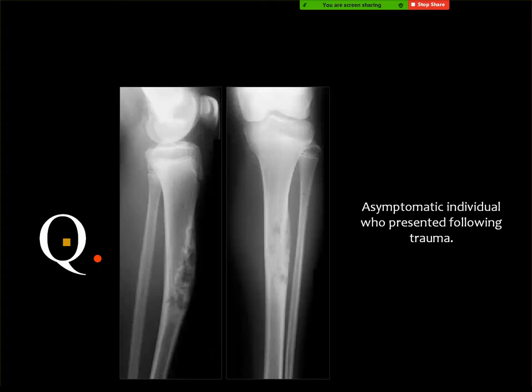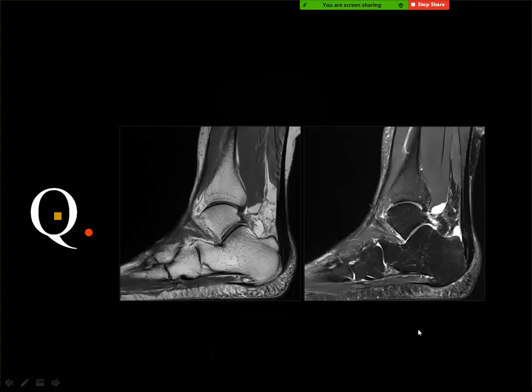Adamantinoma, this is of tibia. Yes, and this is a spot diagnosis lesion which is located in the anterior part of the tibia, and the tibial shaft is a little bit bowed. Then you know that adamantinoma occurs only in two bones, the mandible and the tibia, and this is one of the classic appearances of adamantinoma.